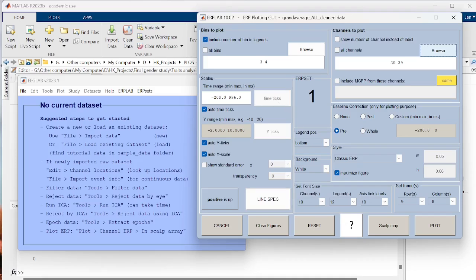Sometimes this menu can be a bit glitchy. If you notice that your min or max seems particularly wild, this is usually because, at least in my case, I haven't ICA corrected my eye electrodes, and I actually exclude them from artifact rejection procedures.